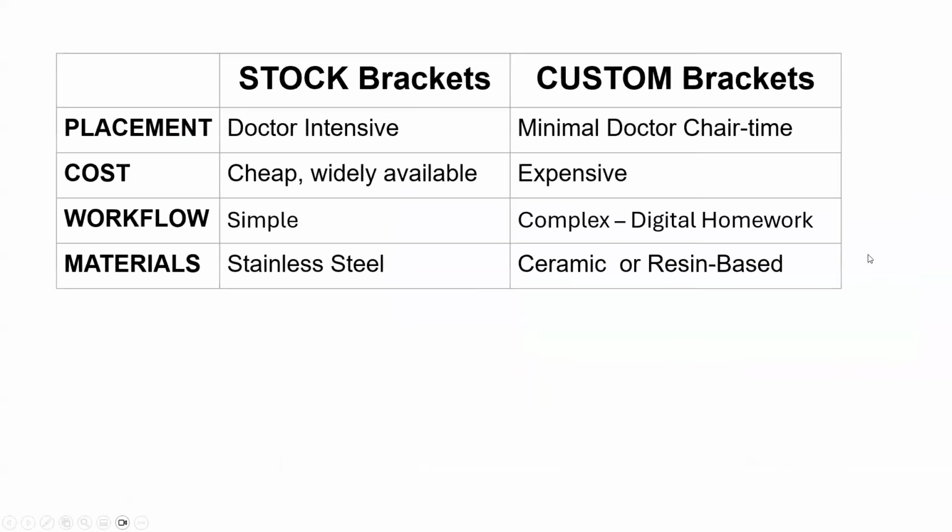And with our bracket setups, same thing. Using DIBS AI software, we can completely customize our setups. So out of the two different options, the traditional stock system that's available or customized setups, there are some big differences. First of all, placement. When you're hand placing a case, and like I said, in a busy clinical day, it's very time intensive and it's stressful.